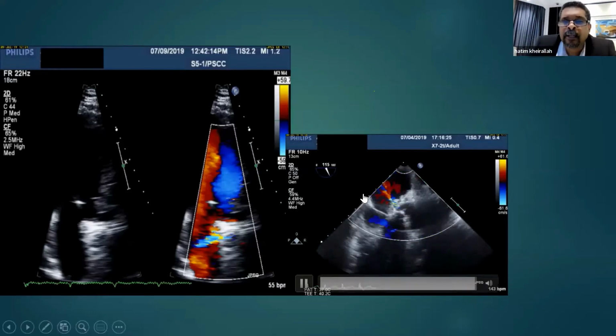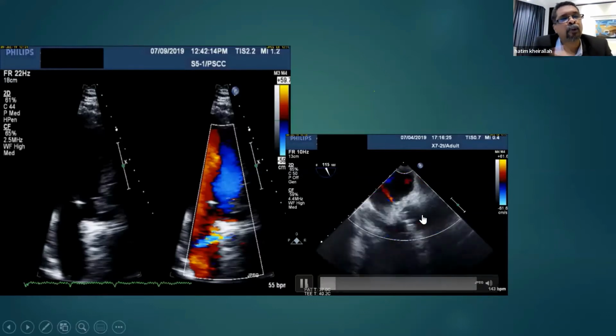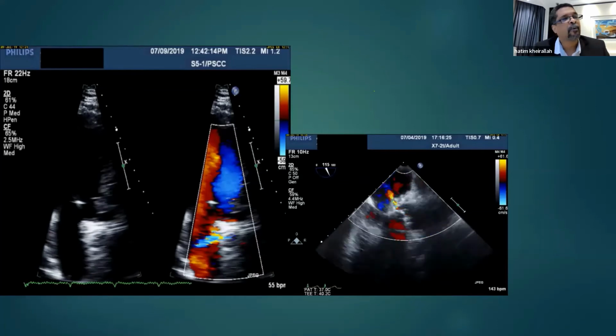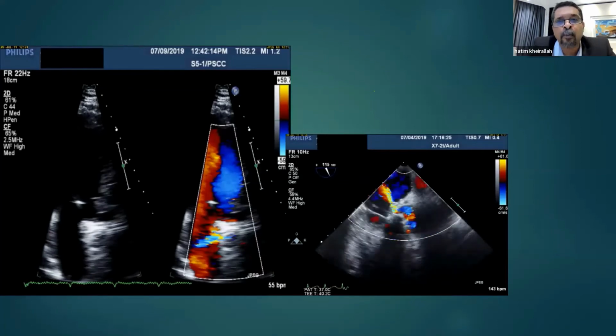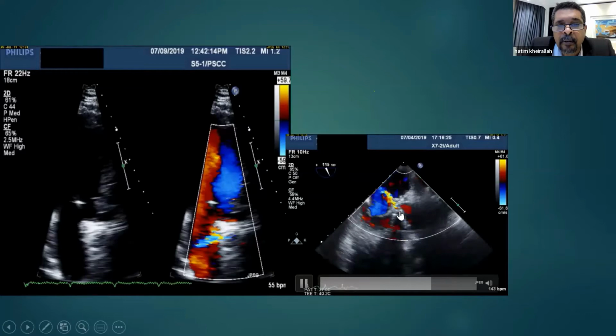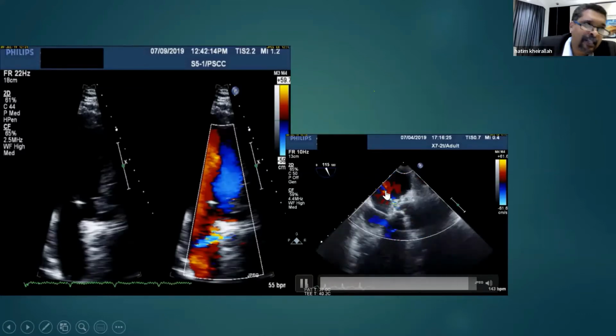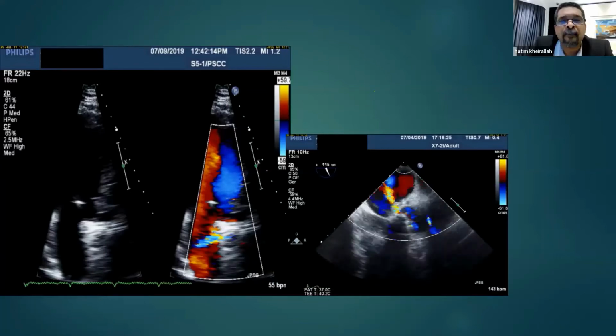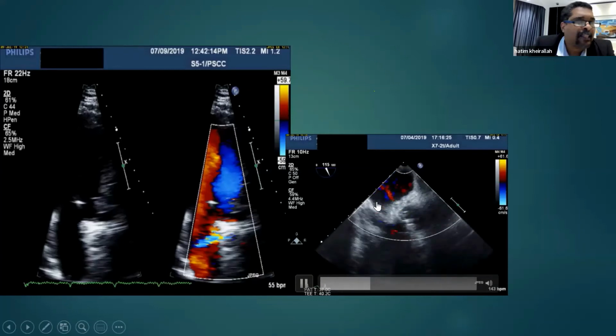Yani the fistula is just a tract between two chambers which are supposed to be independent and not communicating. Now they are communicating. So I would say that this is a rupture or a rupture tract between the aorta and the left atrium. So if you call it rupture, that's not wrong, but it's called fistula, aortoatrial fistula.